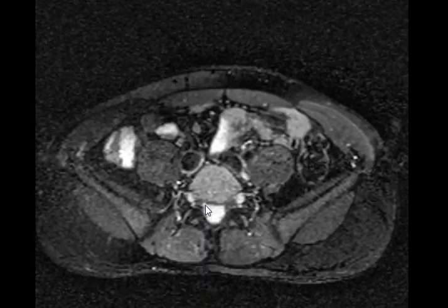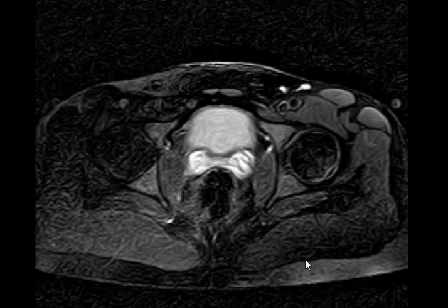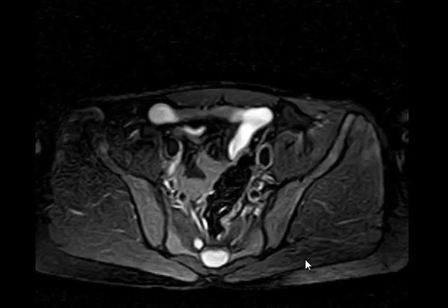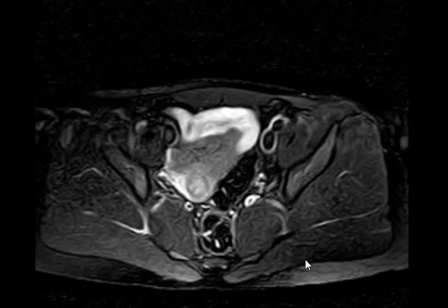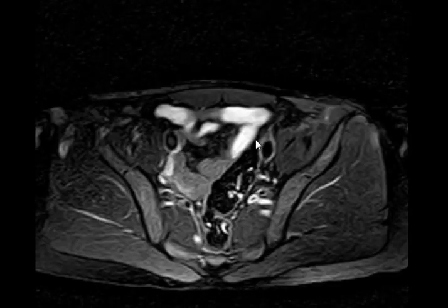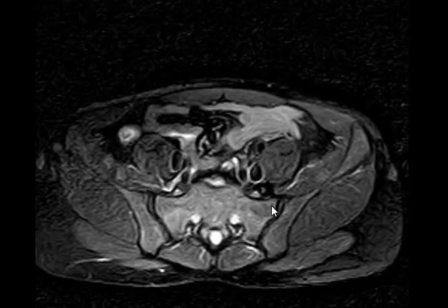You have a lot of sequences. You can just go through them. So, help your colleagues here. What is the sequence? T2, fat saturated, axial images of the pelvis. See other sequences, just not the T2. There we have a lot of things to judge by. Bowel.